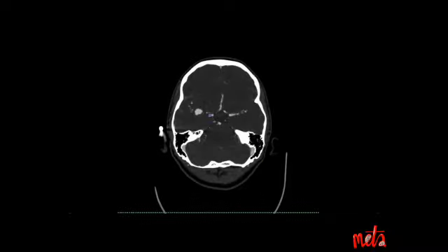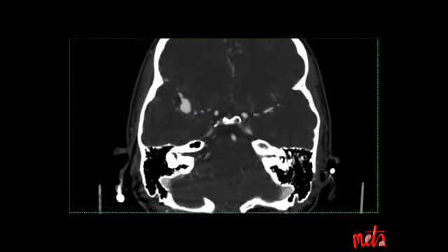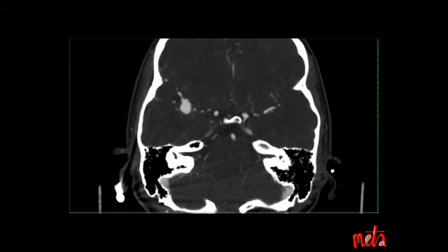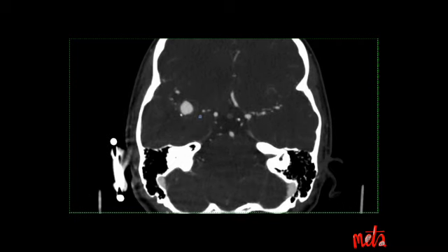So this is the corresponding CTA for the same patient, and you can see that the areas that were bright, that hyperdense rim that we saw in the non-con brain, are actually dark here, aka they're not opacified, aka they're thrombus. And we can see that the darker areas beside them, which represent normal blood, are opacified on the CTA. So the golden rule is that hyperdense thrombus on the non-con brain will not opacify on the CTA, and that calcification is on the rim or outside of the aneurysm and is the same density as bone.